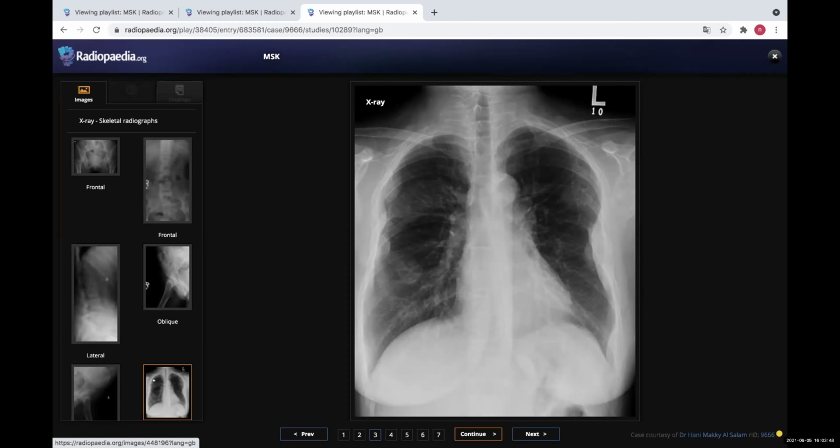At multiple locations. So what do you see? This is not pleural thickening. Just keep looking at the thoracic cage, the ribs and the scapula, and see if you can find something abnormal. Yes, the multiple ribs are also involved with expansile lytic lesions. So what idea do these all give you?